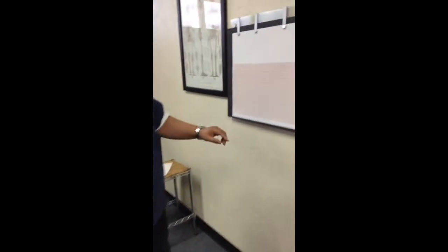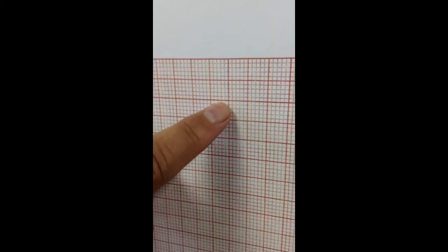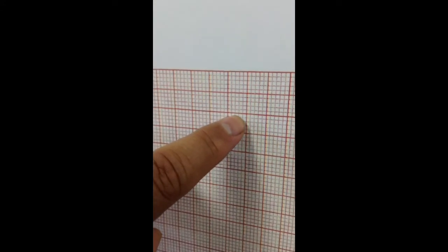But I also have it blown up onto a larger piece of paper. I want to start off by talking about the ECG grid. This is a grid. And if you come a little bit closer, you'll notice in this grid that there are highlighted or dark red lines along with little tiny squares inside. There we go, nice and focused. You have the larger square, but then you have the little tiny squares inside.